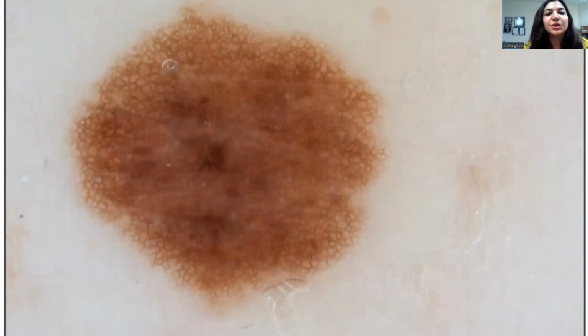Elephants जब आप life में देखते हो तो you're not supposed to give details of the lesions. Elephants means that you're diagnosing a lesion in the duration of a blink. तो अगर blink के time पे आप एक चीज को diagnose कर रहे हैं तो obviously आपसे details की expectation नहीं है. आपसे सिर्फ इतनी सी expectation है कि आप उसको benign कहते हैं या pre-malignant या malignant कहते हैं और आप उसकी biopsy करना चाहते हैं या नहीं करना चाहते हैं.